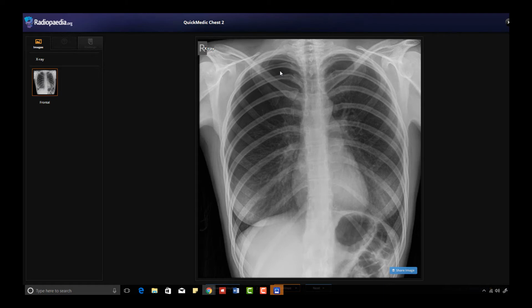But don't stop there, because you will get satisfaction of search. Satisfaction of search is whenever you find the glaring abnormality, which is a right-sided pneumothorax in this patient, and you stop and you don't look at anything else. I'm going to now look the whole way around that lung. The heart, you can trace the whole way around the heart. That's fine. You can trace the knuckle of the aorta and the aortopulmonary window here, and that's okay as well. You're then looking for disability, bones, fracture.